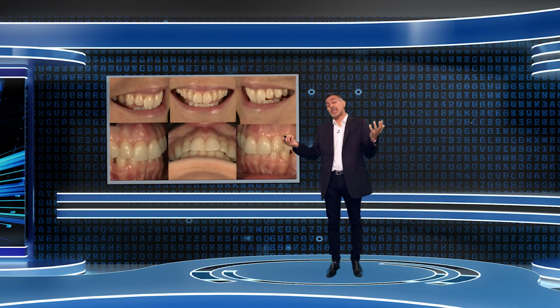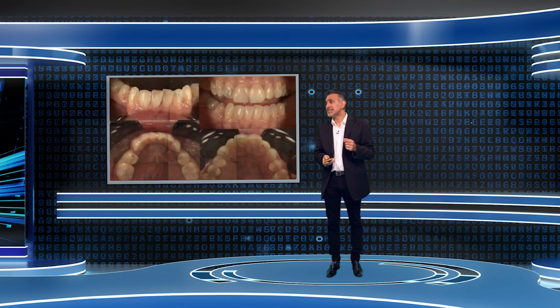Basically, her complaint has been more recently that her bite has been deepening, upper centrals obviously mesiopalatally rotating. She's getting some wear on her lower incisors as well, which you'll be able to see in a second. The laterals are tipping back in a little bit as well.